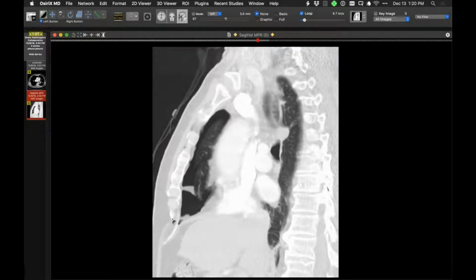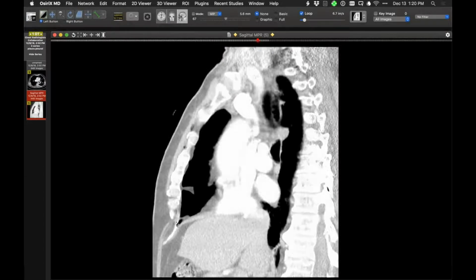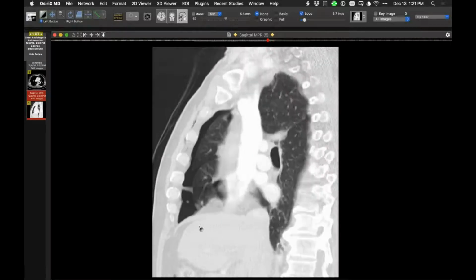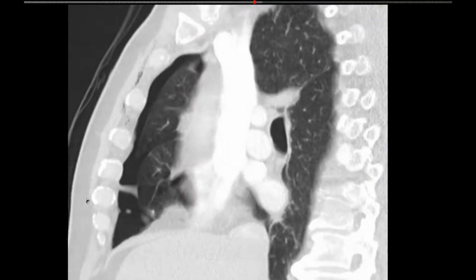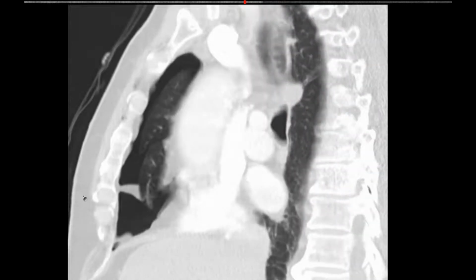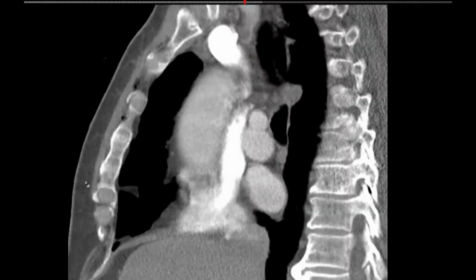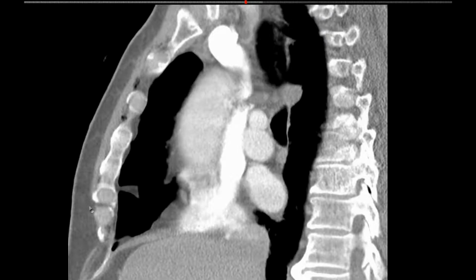Not that it has to do with pneumothoraces, but you wonder if that's the fat that gets torsed in mediastinal fat necrosis, because they're showing it looks like it's on a little pedicle. That's a good idea. I like that. Yeah, I like it too. And also, I think sometimes we see these pleuraliths, and I wonder if some of this fat somehow necroses and calcifies, and you get a little pleuralith. Yeah, you've shown some of those pleuraliths before. Yeah, they're fun. You were calling them pleural mice or something like that? Well, yeah, like a joint mouse, a pleural mouse.